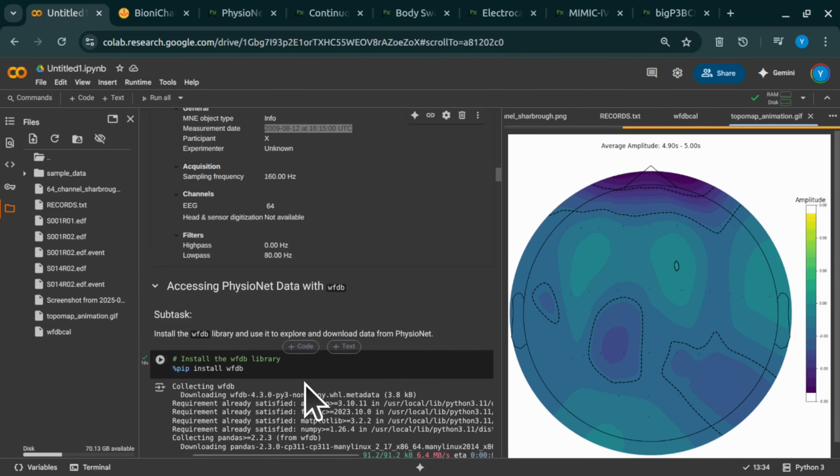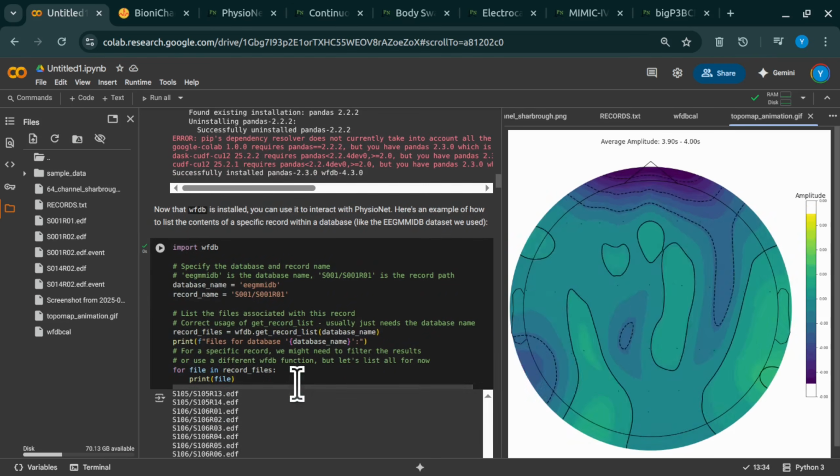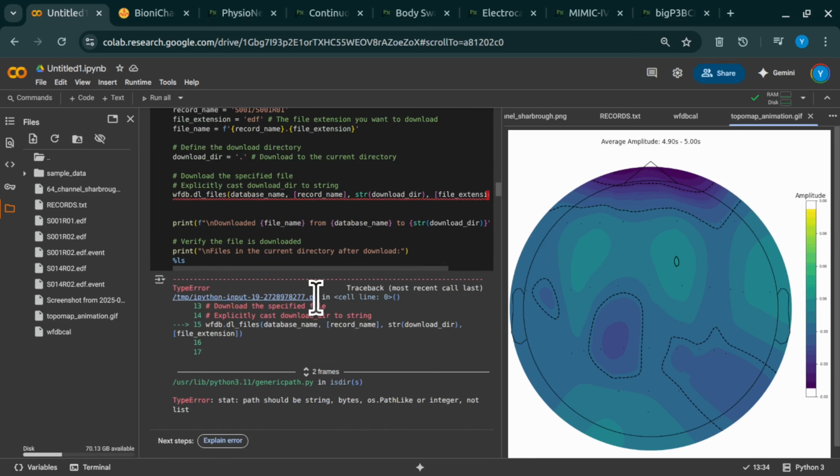Okay, 1 to 40 hertz. Why that specific range? Is that where the interesting brain stuff happens for, like, motor tasks? Exactly. That range covers many of the well-known brain rhythms involved in thinking and moving, things like alpha waves, beta waves, theta waves. By focusing there, we cut out really slow drifts, maybe from sweat or electrode movement, and also the really fast high-frequency noise, like muscle twitches or electrical interference from lights and computers. It boosts the signal we care about.